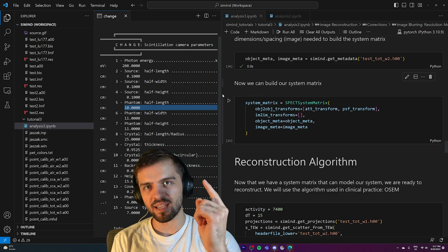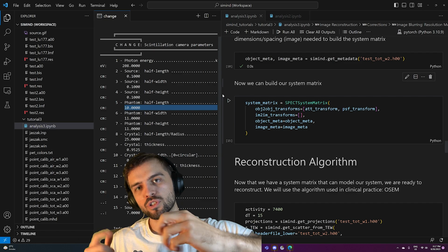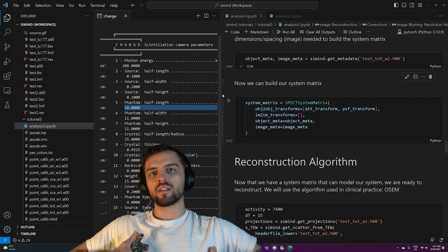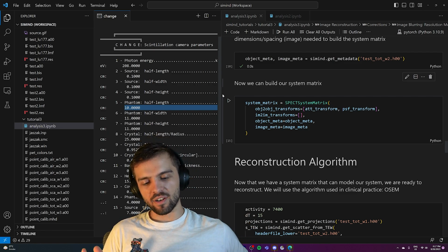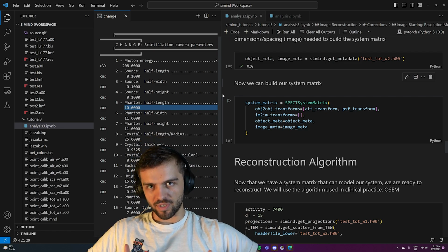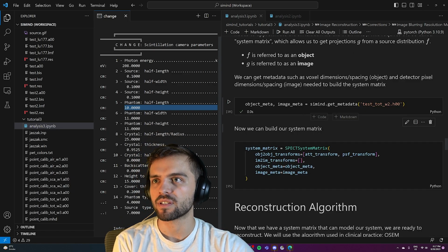You can actually have it be an ellipse, so rather than the detector traveling in a circle, it can approach closer, which is what it does in clinical practice. Like, we're not circular, most of us aren't circular. So you can have the scanner come as close as possible and travel in sort of an ellipse-like pattern. But anyways, for now it's set to 15 centimeters all the time.